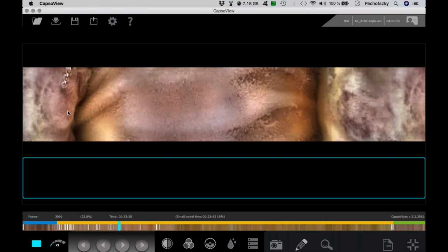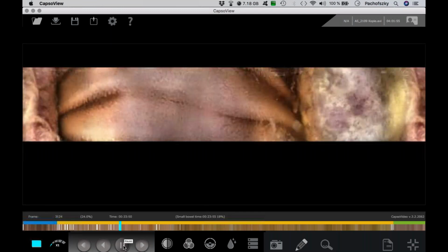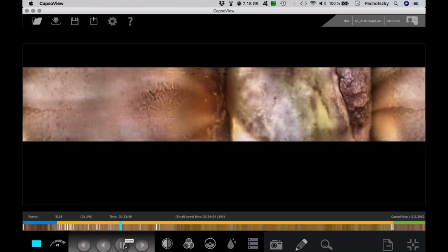the really big ulceration of this process in this area, relatively normal mucosa also in this area, and here the big ulceration. So we have here another picture, relatively normal villi, here the big ulceration, and this is the bleeding source for this iron deficiency anemia in this patient.